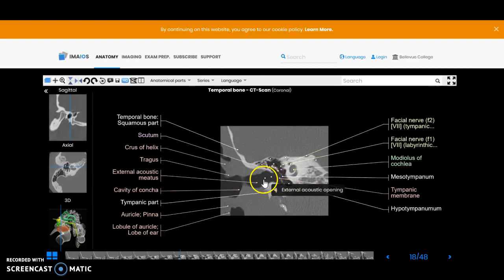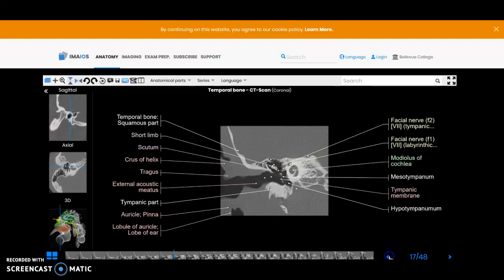And now you're seeing the external auditory meatus and just catching the tympanic membrane here. Now I'm going to show you that here on the axial slice. We're almost getting into the external auditory meatus, and we're in the cochlea here. And then also, we're just coming into the cochlea here. So you can see it in all three planes, and we're going to keep going anteriorly to get all the way through it. Nice swirl of the cochlea there.